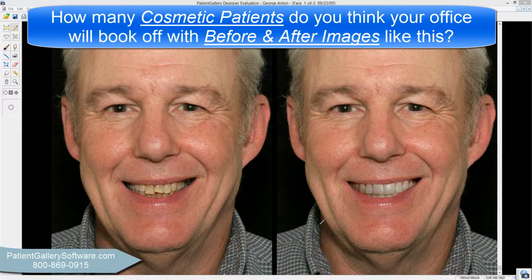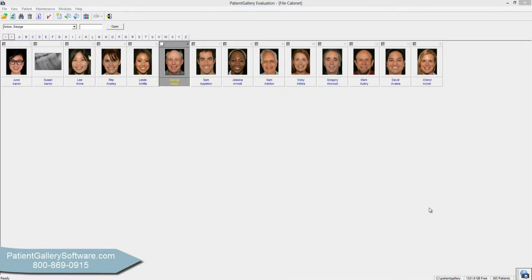So I guess I would like to ask you, what do you think that one cosmetic case like this would be worth? I gave you a good idea of how easy it is to do teeth whitening, putting in a new smile into a patient's mouth.